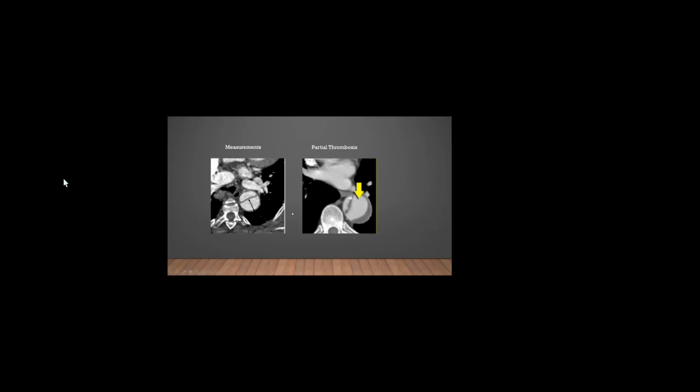Sometimes some organs are being supplied through an artery, for example, the renal artery sometimes arises from the false lumen. So they keep perfusing the false lumen because it's supplying some organs. However, this can change, and sometimes there is a dynamic process in the dissection of the descending thoracic aorta.